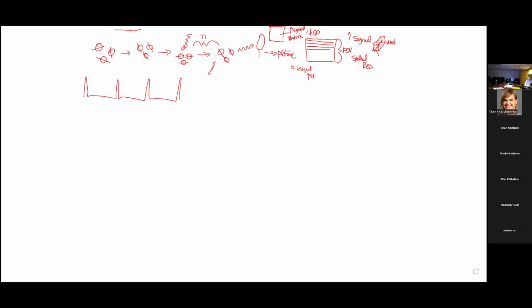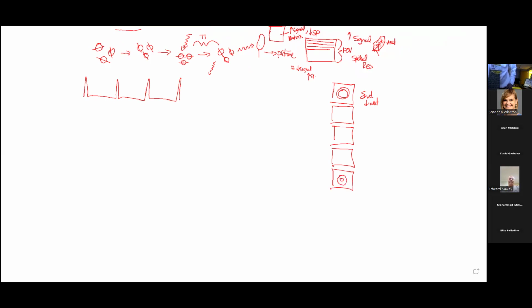We had to make the movie, because we had to capture end diastole, when the LV was really large, and then get all the way down to end systole, where the LV cavity is really small. How do we do that? We talked about when we had a normal regular rhythm, we had these phase encoding groups.